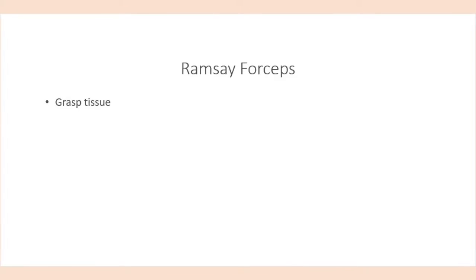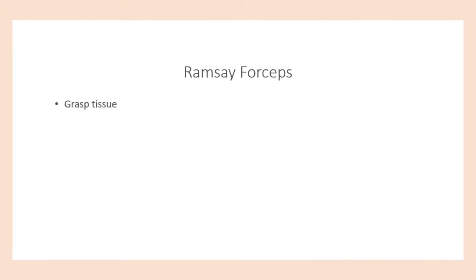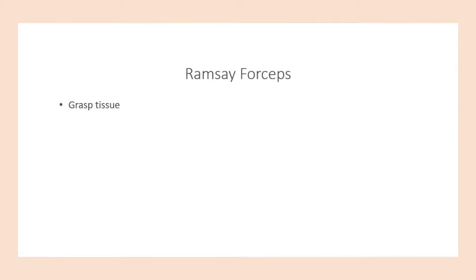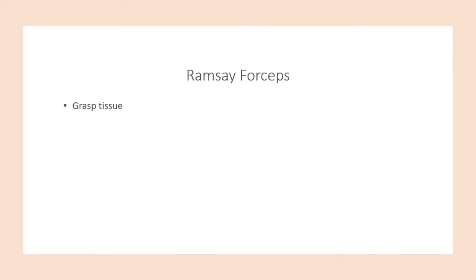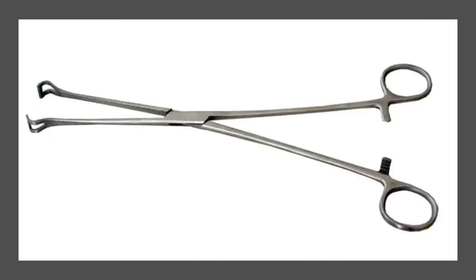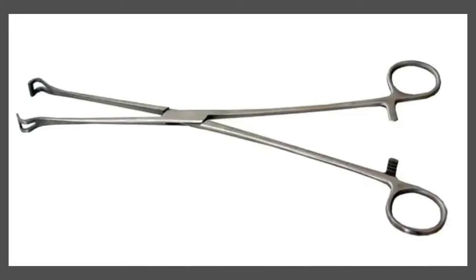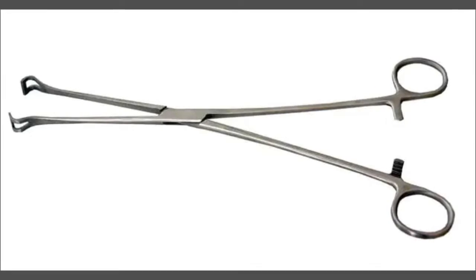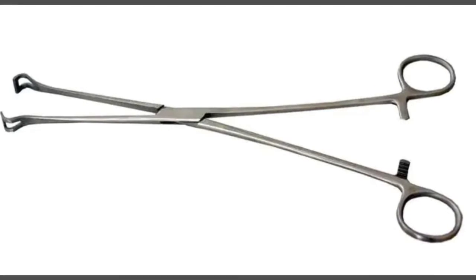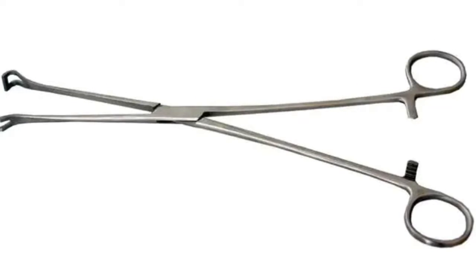Now this is used to grasp tissue. You may recall this to be tooth or non-tooth, and it's probably something you ask all the time when you perform your abdominal surgeries. Right, so this is our next instrument. Please have a look closely at it and think about what it is and what can it be used for.